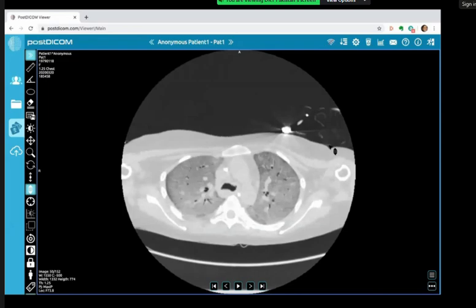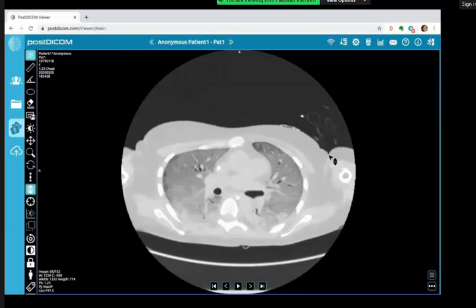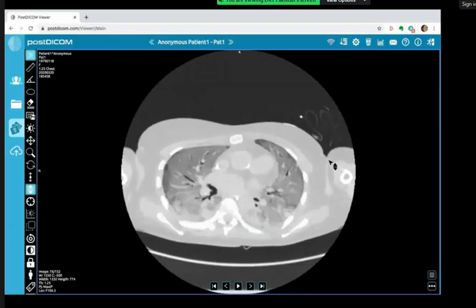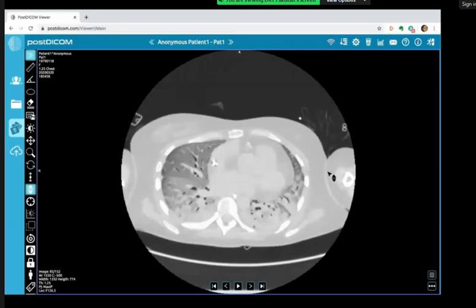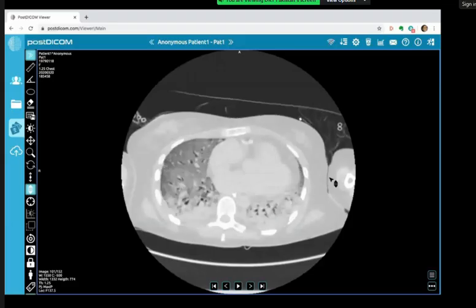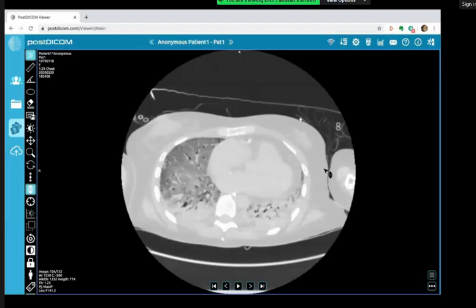There's diffuse abnormality of both lungs with confluent ground glass opacification, probably some interseptal thickening giving a degree of crazy paving, more dense consolidation in the bases. There are air bronchograms throughout both lungs. Again, with the pattern, PCP will be up in my differentials. This picture can also be presented as an ARDS, with the patient intubated and acutely septic, with a gradient and consolidation in the bases.